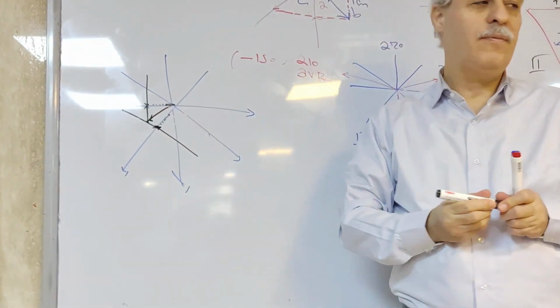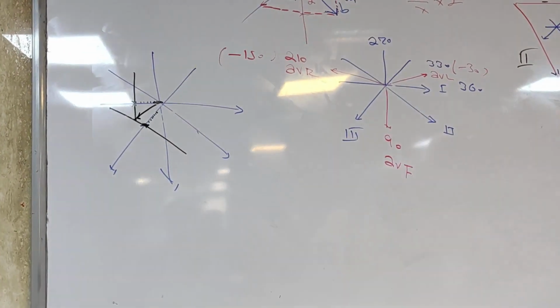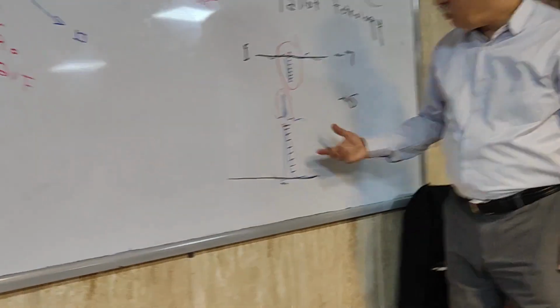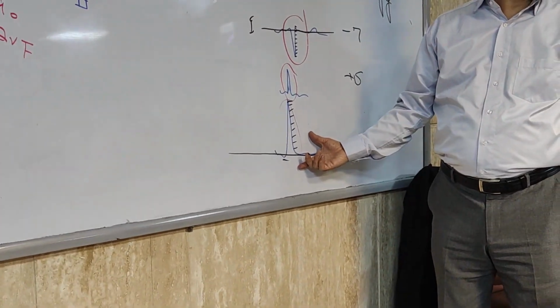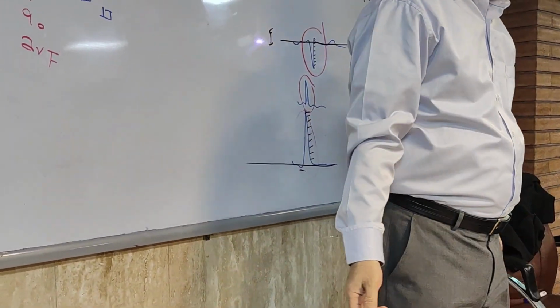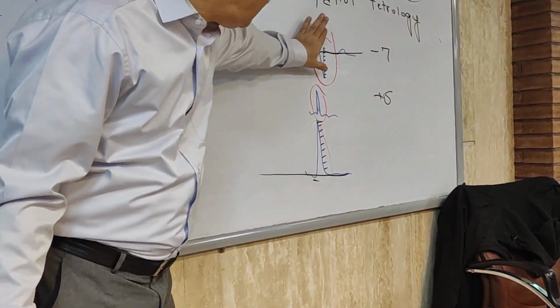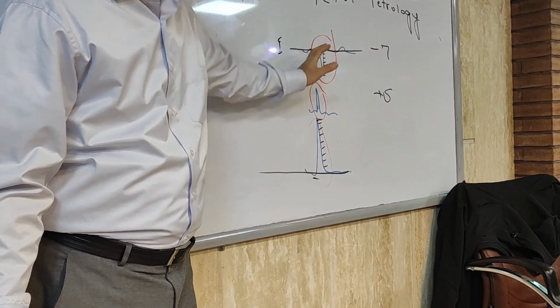You didn't get it? Wow. This is the QRS complex in limb lead 1. This is the QRS complex in limb lead 3. Yes. Limb lead 1, limb lead 3. Make the net deflection of QRS in limb lead 1.